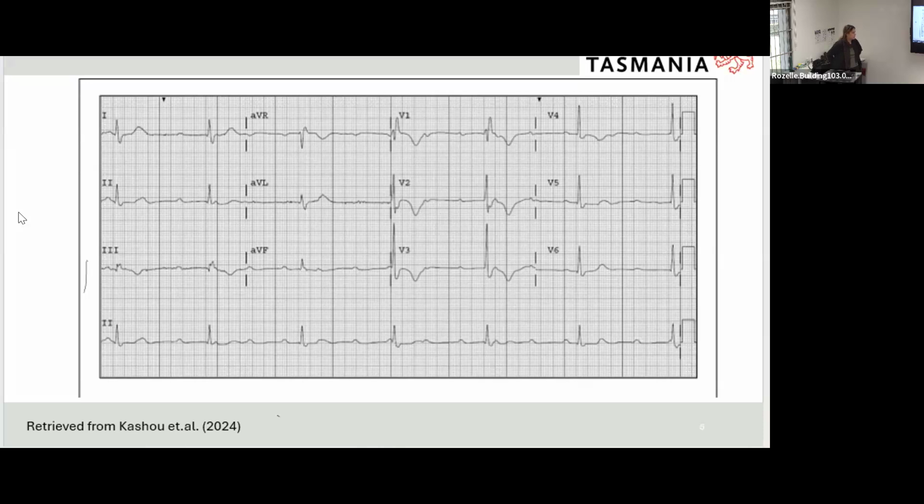Alrighty. Are there any questions from that? Obviously, it's a really complicated ECG to start off with, but it does show lots of different things that we are able to talk about. And everything else is going to look easy now by comparison. Yes, to Nina's point, our stroke volume and our heart rate are going to be a problem here, because the atria are not conducting with the ventricles. So cardiac output will very quickly become a problem.